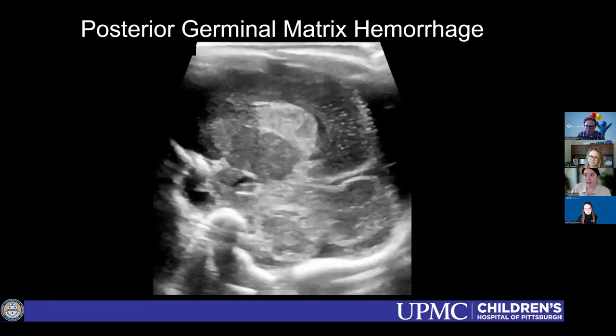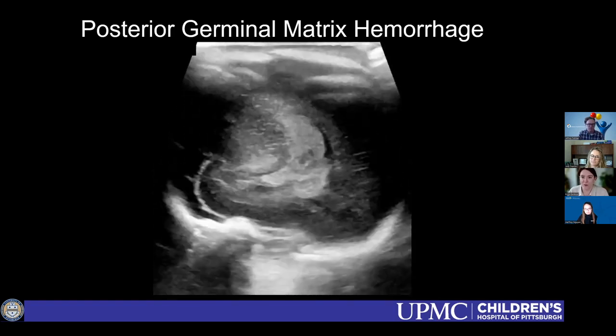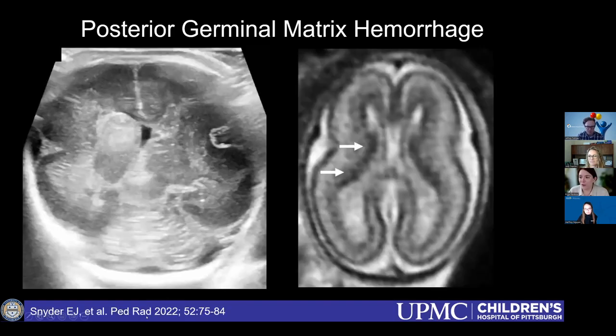Yeah, I agree. I think these cases are always challenging for us in radiology because we often argue a little bit about how we should grade this. Our NICU similarly really wants a grade because it also helps them to counsel families and to plan follow-up.